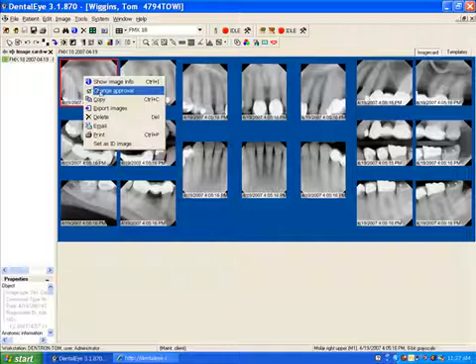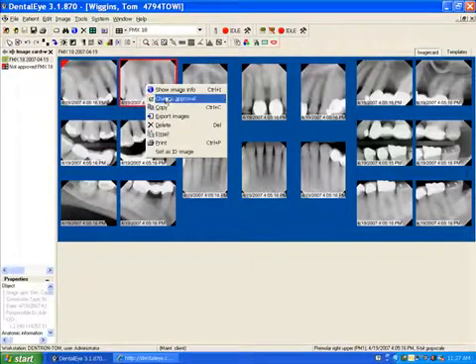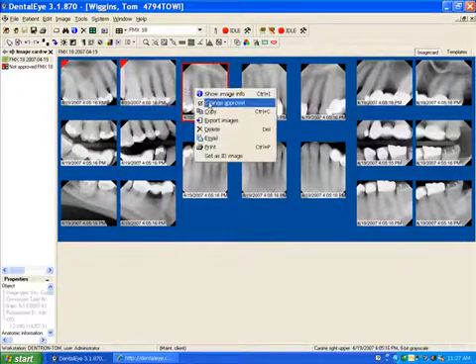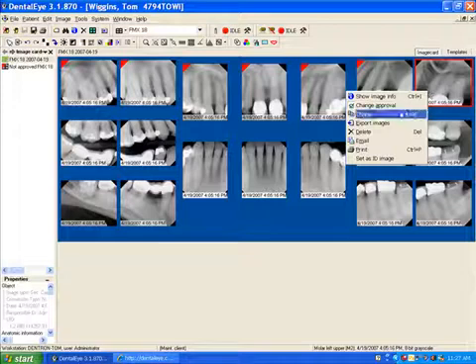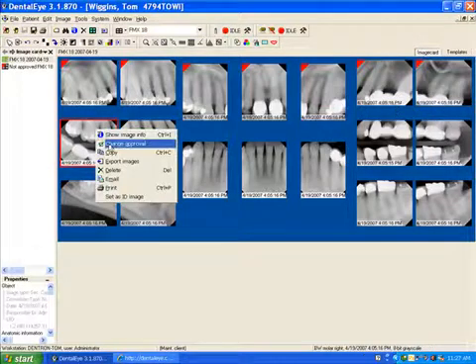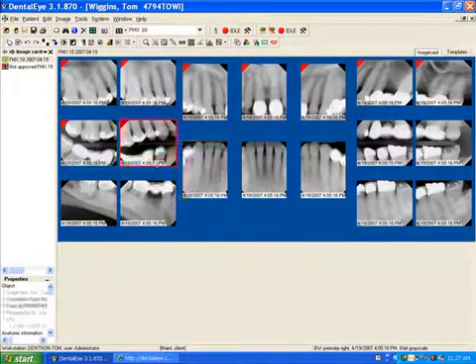The images must be unapproved, so you have to change approval on the images if there's not a red triangle in the upper left-hand corner. Simply do that by right-clicking on the image and click on Change Approval. You must have change approval rights to do this.